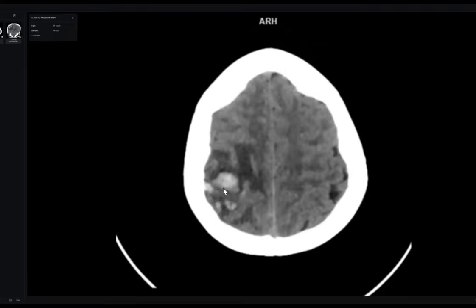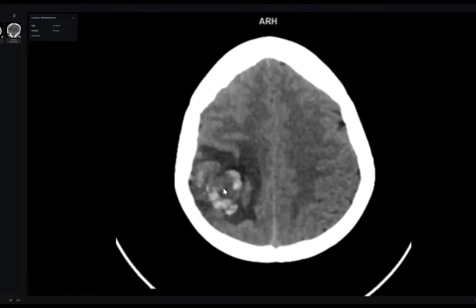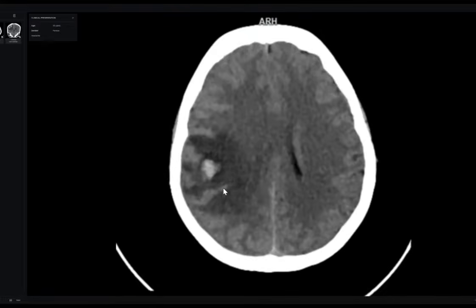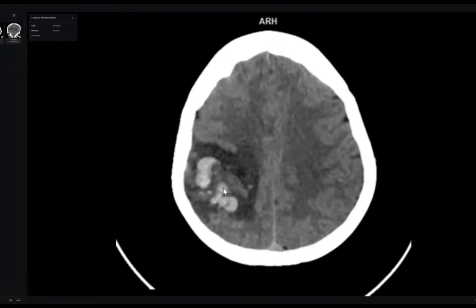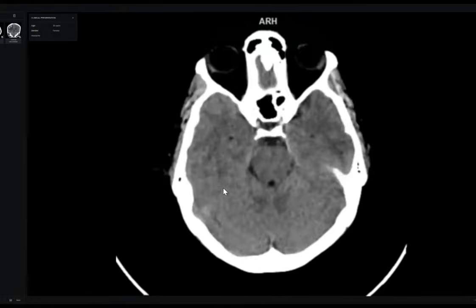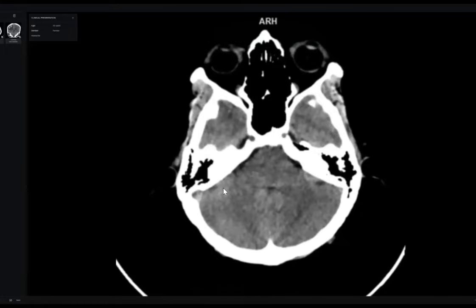Okay. Do you know any other causes of hemorrhagic infarction? This is a question out of the exam, by the way, but I just enrich the discussion. Do you know any other causes of hemorrhagic infarction? I'm talking about arterial infarction. Could it be infarction following subarachnoid hemorrhage? No. I'm talking about infarction. Originally, the pathology is infarction, and it gets some hemorrhage.